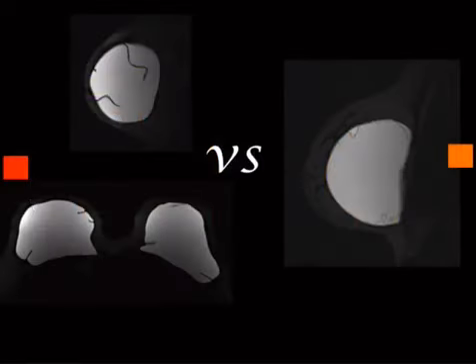Okay, so this versus that. So we've got squiggly looking things inside of a boob, bilateral boobs that are slightly different squigglies. Now the first thing, and I've mentioned this in numerous other modules, is to describe the sequence. Breast MR, which we talked about in the last lecture, has specific sequences to look at the breast tissue.